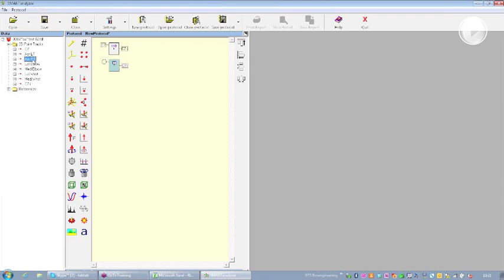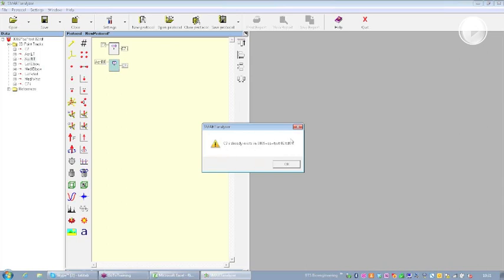So I'm going to get the acromion. Here I have a warning that tells me to be careful, because the name of the output of this operation already exists in this trial, so I need to change it. So I will call it acromion right side interpolated, and so on.